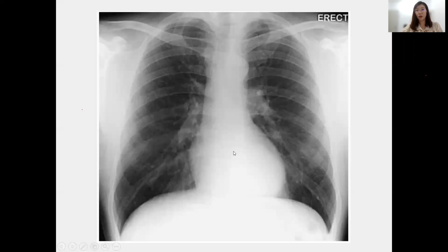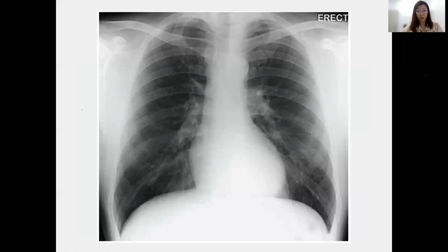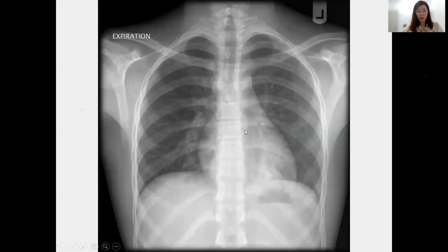From lung or from posterior mediastinum. All right. So another thing will be, look at this quite fairly normal X-ray. Another thing will be the paraspinal line here. Always review this line because some of the opacity can arise from just a small bulge here, okay? Just like in this case. Can you see? Oh, yes.